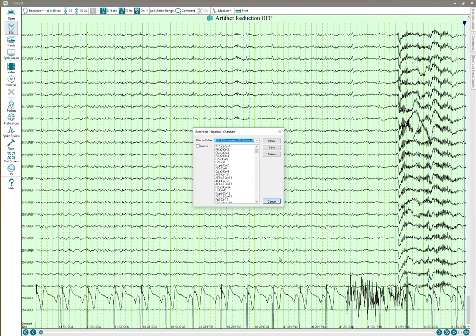Version C won't have a problem with this, but for anything prior to that build, like version 14B or B1 through B3, just show the EEG page so we're not switching channel maps with the trends displayed. And also, if you've already got trends calculated, you want to clear those using that clear button on the system button bar to get rid of those.